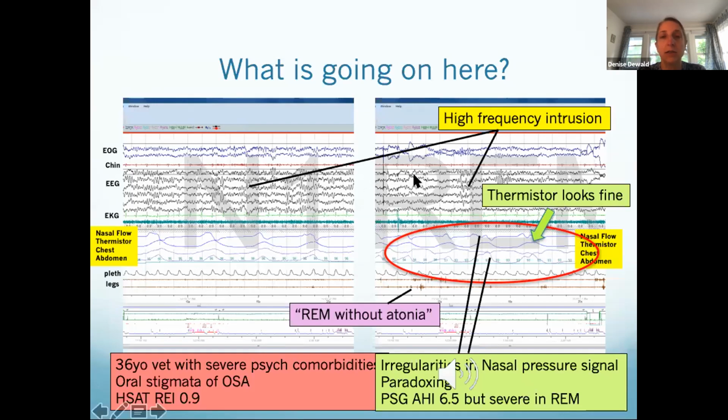He couldn't really get into any decent sleep. You see this a lot in people with depression, this alpha intrusion into their sleep. When I read sleep studies, I see this a lot in people with mild sleep apnea, a UARS type situation, with psych comorbidities.